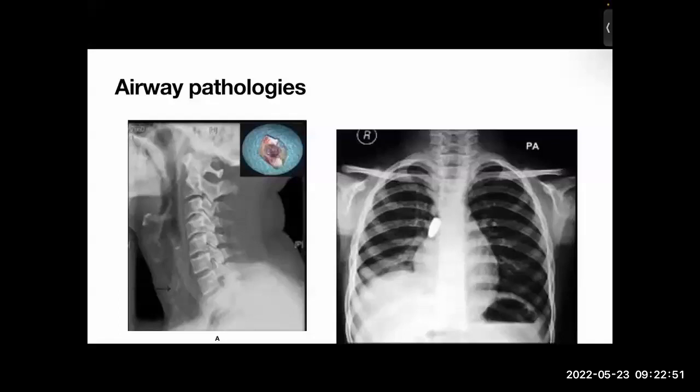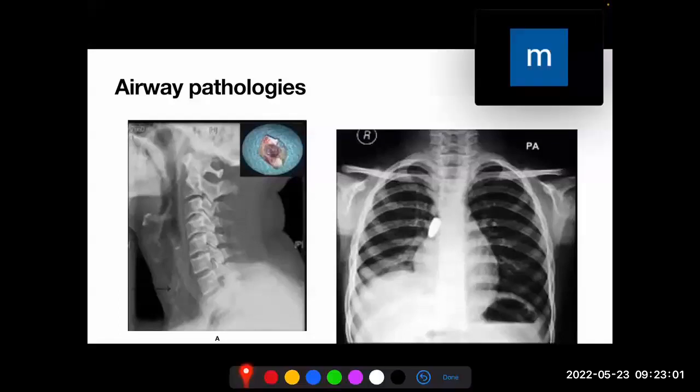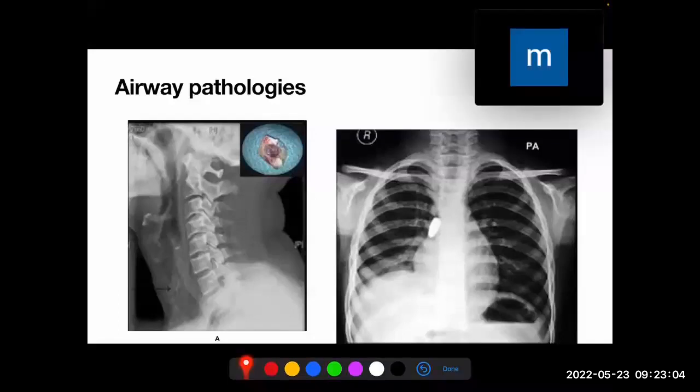First of all, this is the lateral C-spine or lateral neck X-ray. Although this is not part of what we are supposed to do, let me just take you through this. Look at this. These are the vertebral bodies down here, up here, and then those are the anterior spinal, posterior spinal lines. Forget about the lines now.